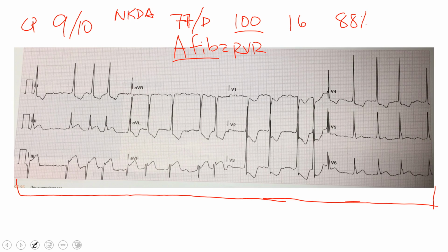So you guys know, if you've watched my stuff, the way that I like to do it, I'll start here, here, here, and here, and then go for inferior, then go septal, and then go anterior. So knowing that, let's look for any elevation in lead 1. We do see some depression, right? It appears to be some depression. aVL as well has depression. V5 and V6 appear to be pretty normal.